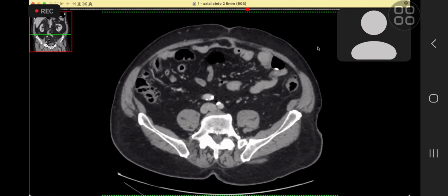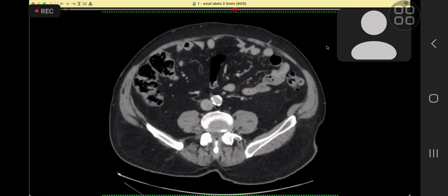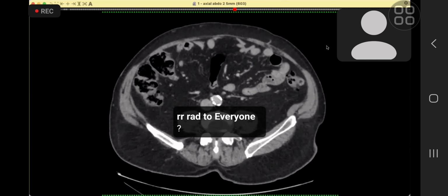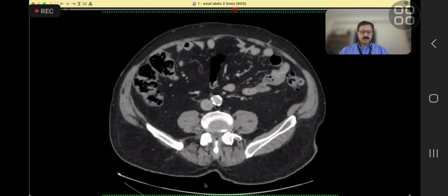Yeah, so in summary, this CT abdomen pelvis demonstrates a free gas locule within the urinary bladder, and I'd be suspicious for an acute vesical injury. In my routine practice, I would review the rest of the images for any further acute findings, including any bony fractures within the pelvis. I would like to inform the clinical team urgently and also recommend doing a CT cystogram for further delineation as well. Okay, thank you.